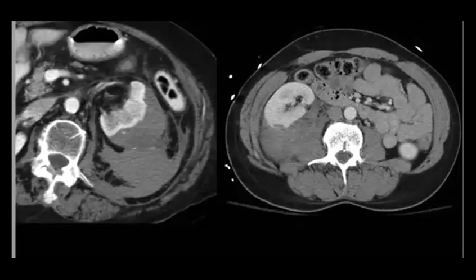So what about this one? With again perinephric hematoma. But what happened here? Why grade 2? So it is subcapsular hematoma again, but what? There is renal injury, subcapsular and perinephric hematoma. Yes, perinephric hematoma, so this includes the left perinephric collection.